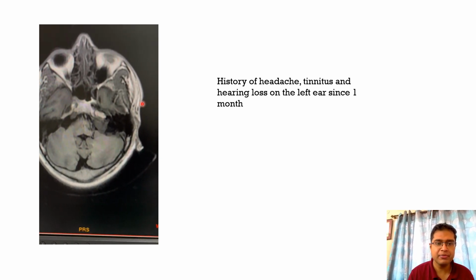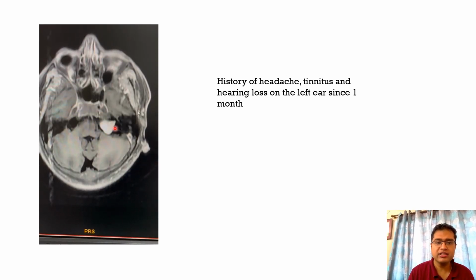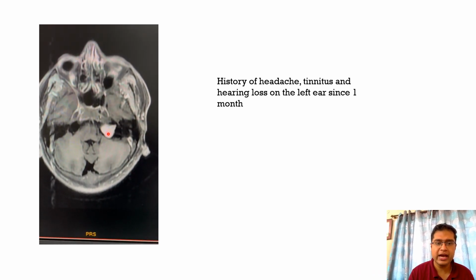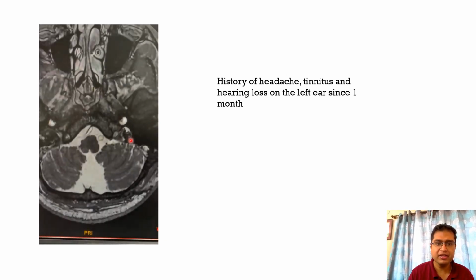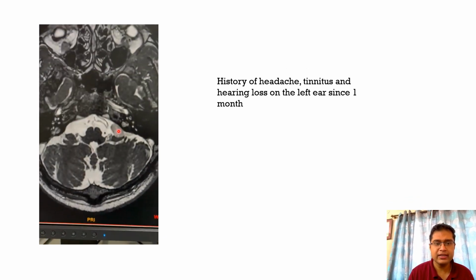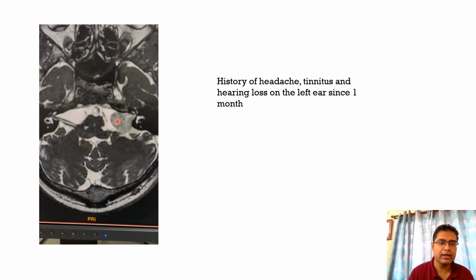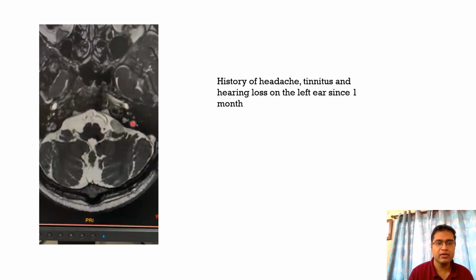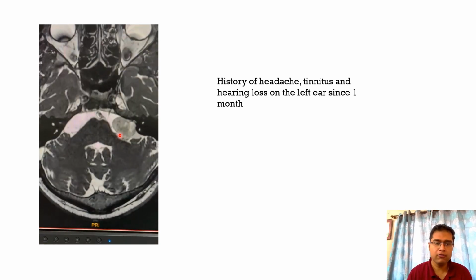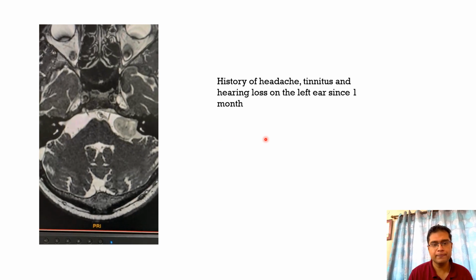These are the T1 axial images. These are the post-contrast images which show intense contrast enhancement in this particular mass lesion along with the ice cream cone sign. These are the Fiesta images, the CIS images, where we can see that the lesion is actually extending into the internal acoustic canal, suggesting a diagnosis of schwannoma more likely than a meningioma.